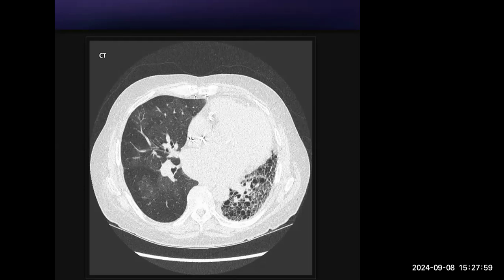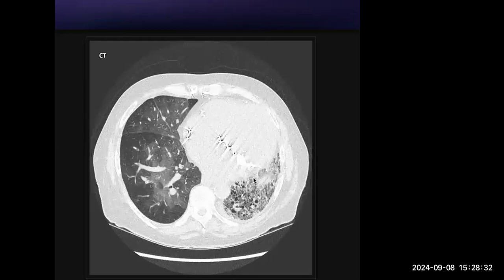The right lung presently has just some changes due to altered hemodynamics because the left lung is collapsed. So the changes would represent perfusion changes. It would not be pathologic, though I would look at the mediastinal window to see whether any pulmonary hypertension has set in. In that case, it could also be because of pulmonary artery hypertension or some air trapping. I would do an expiratory CT for that, but I do not see any bronchiectasis or any nodules. This is the expiratory CT for you.